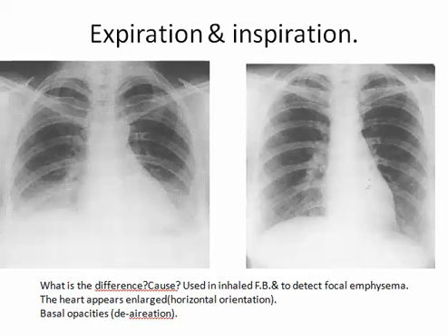The heart here in expiration appears larger because of horizontal orientation. Expiration makes the diaphragm higher, and thus the heart acquires a more horizontal orientation. And the basal opacities here are not due to disease. The basal opacities are due to deaeration.